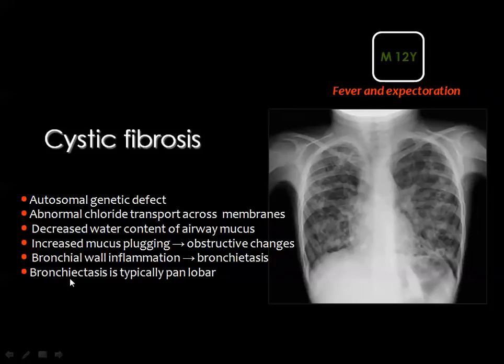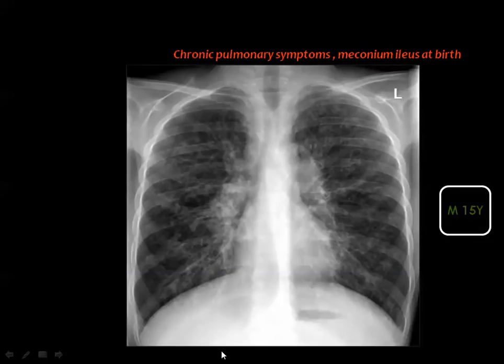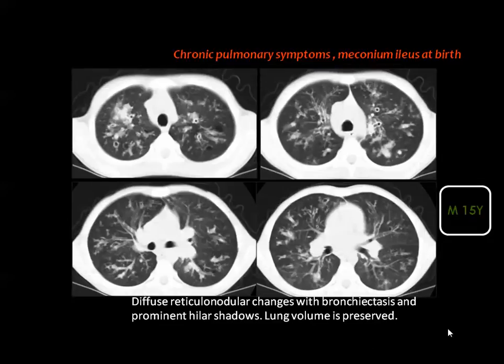And the bronchiectasis usually affects most of the subsegmental bronchi. And if you look to the chest of a child and you see this appearance, you got here diffuse lung disease in the form of strandy opacities everywhere in the lung. And of course, it's difficult to see the dilated bronchi throughout these opacities, but usually you need the help of CT to confirm the diagnosis.